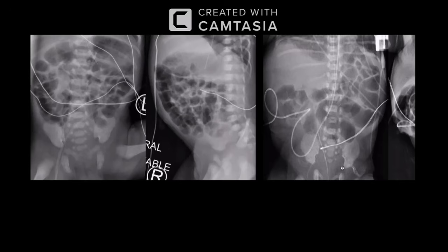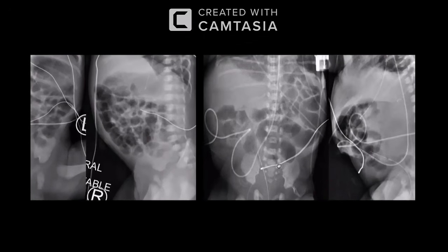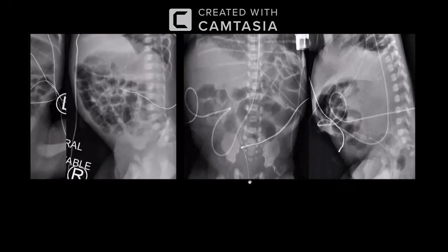Even in the exam, if you are not able to see the exact position, they are not going to ask for it. At least we can mention a malpositioned umbilical arterial catheter. In the next case also, you can appreciate the catheter going here, but on a lateral radiograph we can actually see this course here. Can you see? Follow this course. It's going into the renal system, a renal vessel.